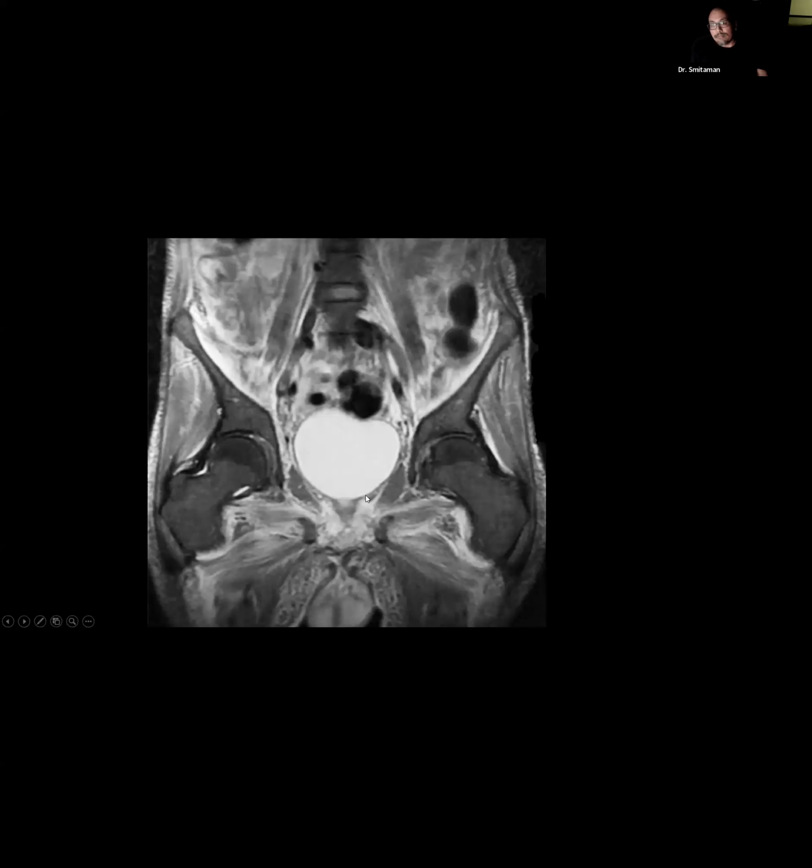Moving right along, this is a case, again, indistinguishable from poly or dermatomyositis. This turned out to be HIV-related myopathy. And this is thought to be seen in HIV patients, multiple factors, whether it's due to the virus, the drugs, or the host immune response to the virus.